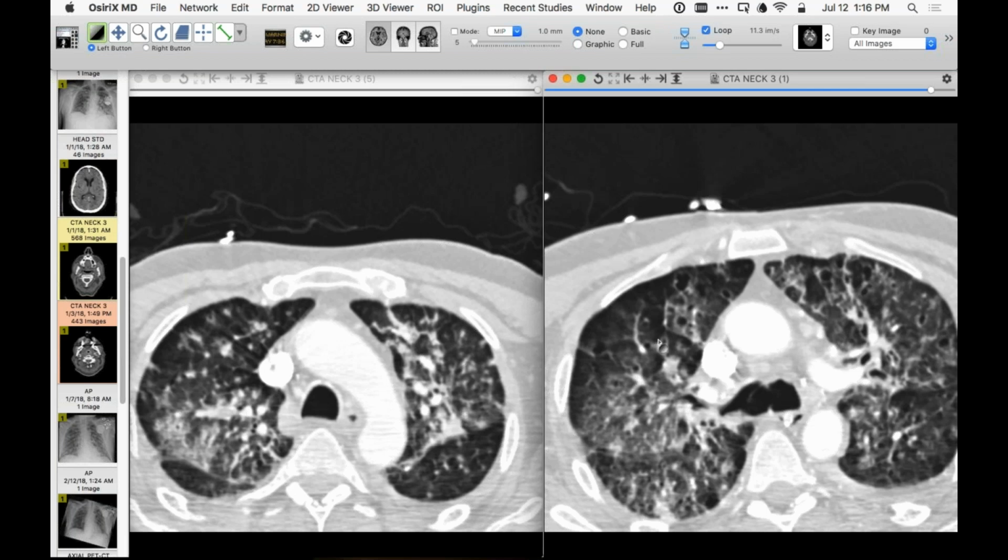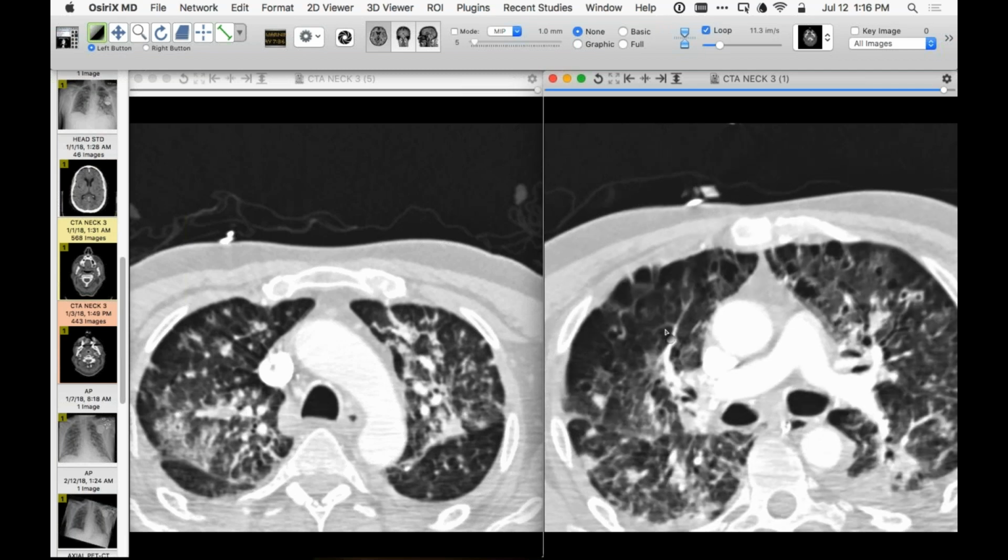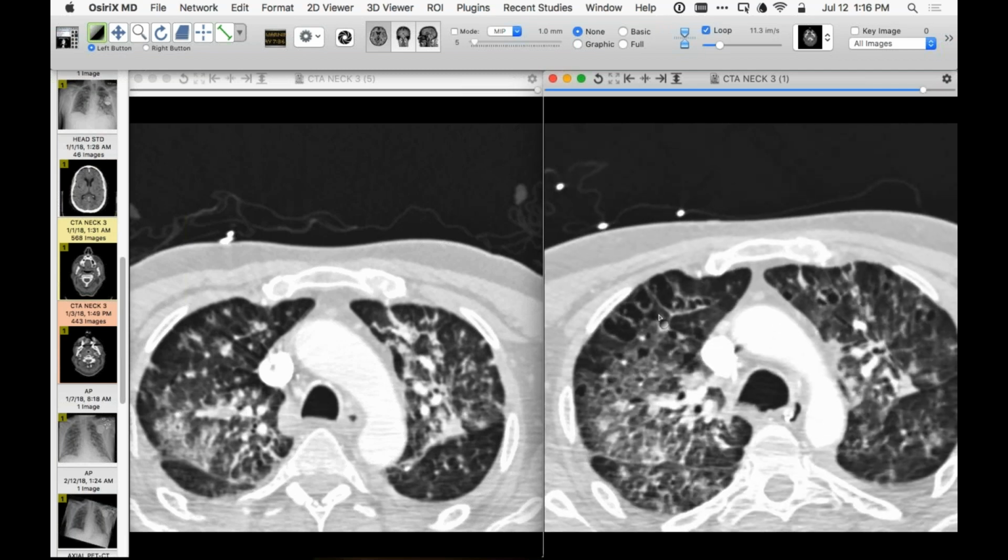Typically when I see a tremendous necrotizing pneumonia and the presentation is suggestive of infection, one would think of maybe staphylococcus, but maybe pneumocystis, although I'm not sure I've seen the cysts of pneumocystis develop so quickly. But that is really dramatic.